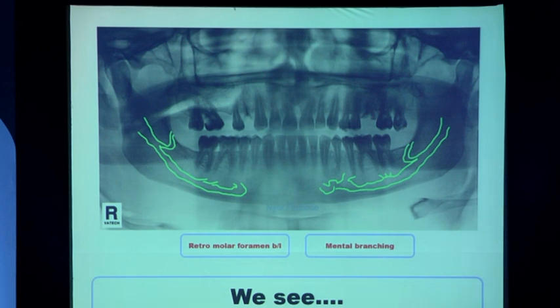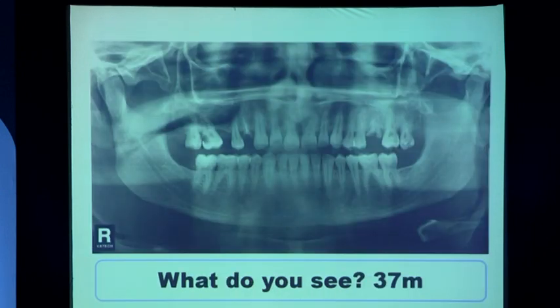See, again, if you try to interpret too much, you begin to see what is not there. Because you're seeing too many variations, you're searching in the wrong places. Actually, the variation is here. When you follow the mandibular canal, it is not straight. You see a curve here, you see a small canal coming out here. This is a retromolar canal.